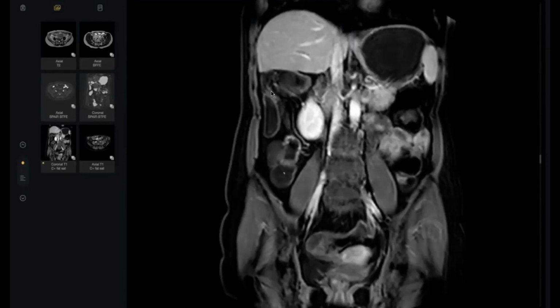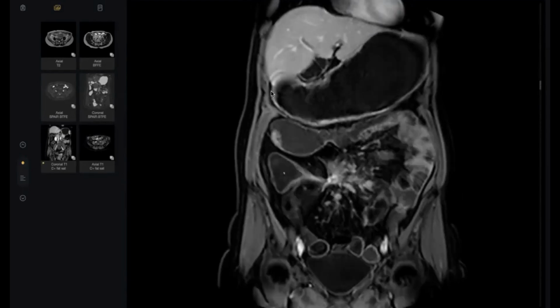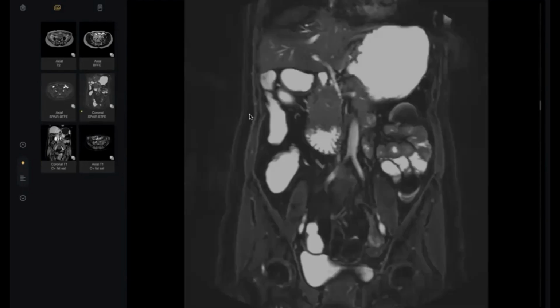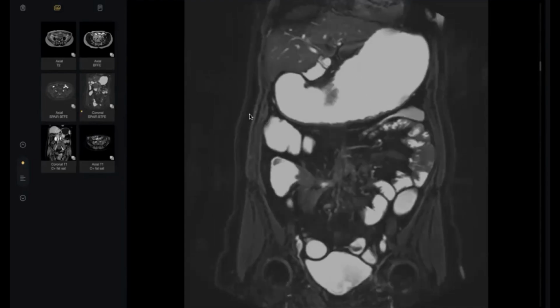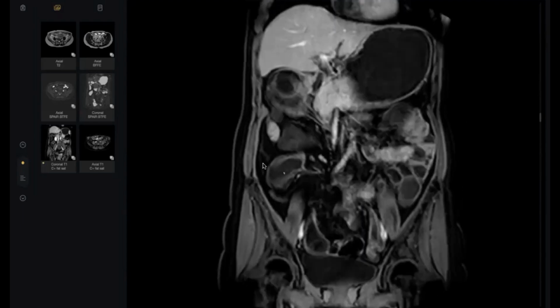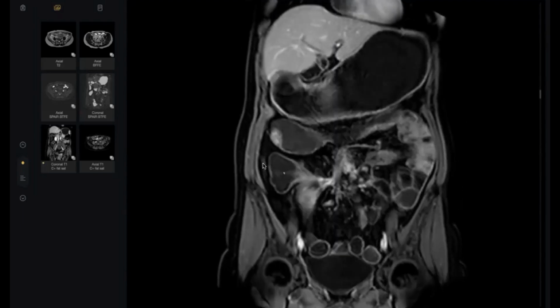Complicated by multiple fistula formation. Why is this not tethering? Why is this not the tethering of the carcinoid? Look at T2 or STIR. Where is the mass? Where is the mass here? Compare with post-contrast. This is fibrosis. Tracks, fistulous tracks surrounded by fibrosis.